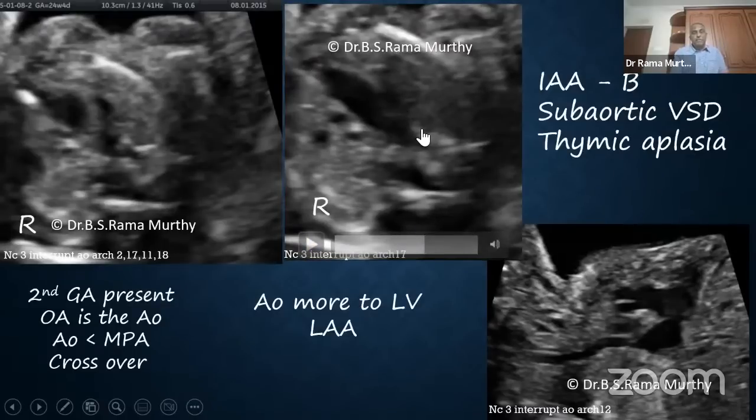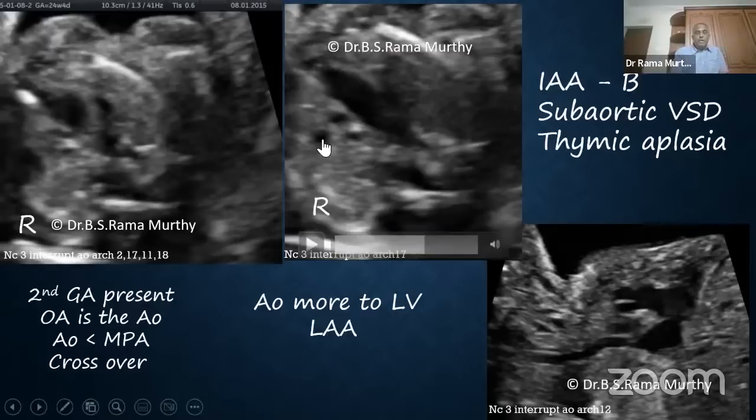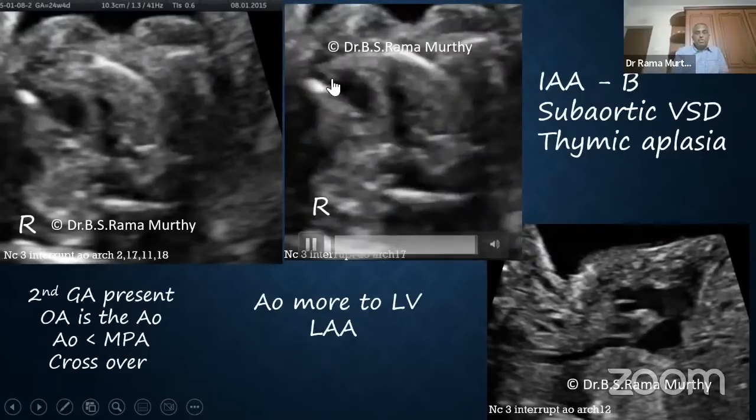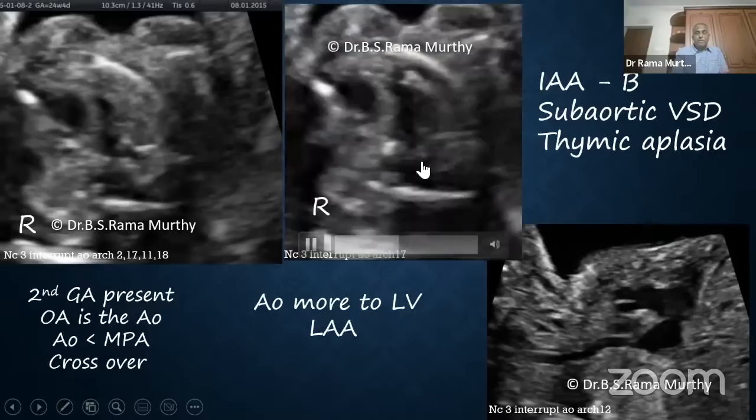So this is a total mirror image. Total mirror image. Always aorta was big, and for once the aorta has taken a back seat. It is narrow. It is equal to or even maybe slightly smaller than the SVC. Pulmonary artery is huge, right? And what I'm going to do now is to ask you to see the ductus arch. You can see it very well because it's prominent.